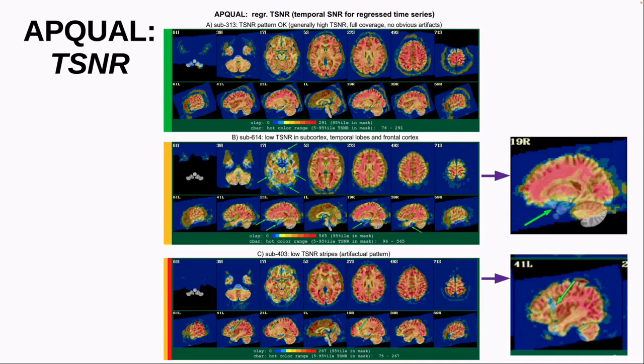So that's how it's computed, and we get TSNR maps out of this, and we can see what a good one is here. That's up here. This is generally fairly high through the brain, more or less consistent. Comparing that to this one, I've blown up an area of one of these slices to show you that this has a dropout.